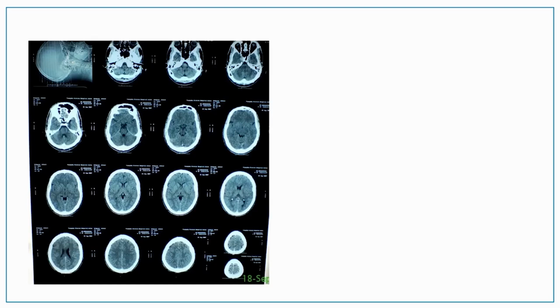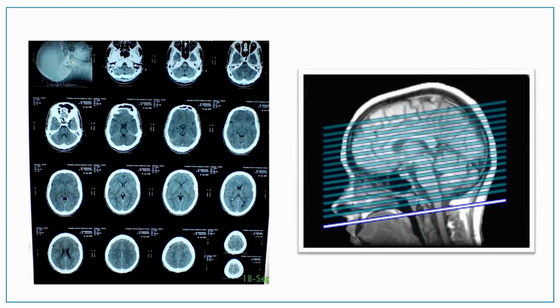Do you want to try with me once again on how to go through these images? Your first image is your slice thickness. What do you think this is? Medulla. You've got the middle cerebellar peduncles, pons, midbrain, quadrigeminal cistern, internal capsule and thalamus, lentiform nucleus, lateral ventricle, choroid plexus, body of lateral ventricle, cerebrum proper.